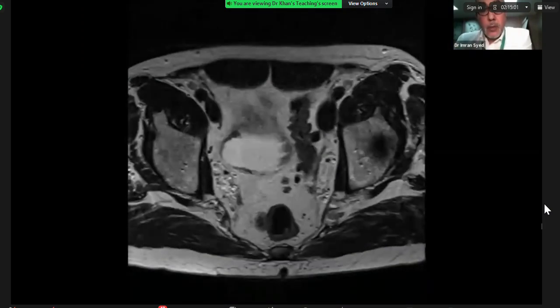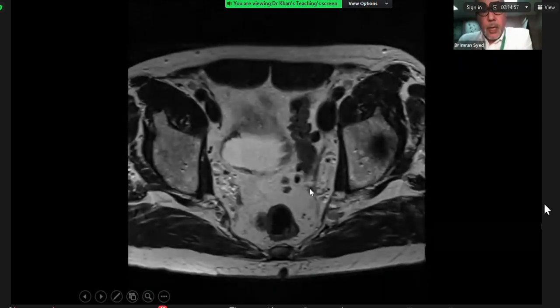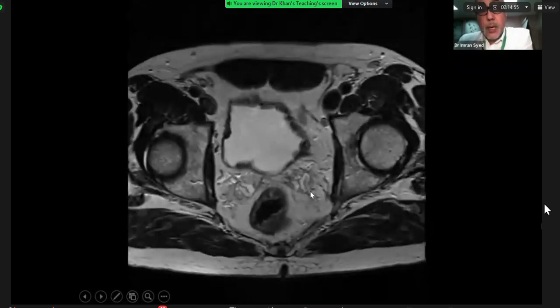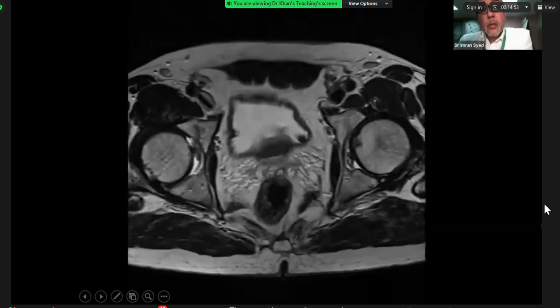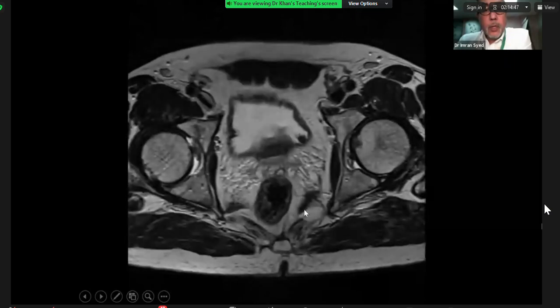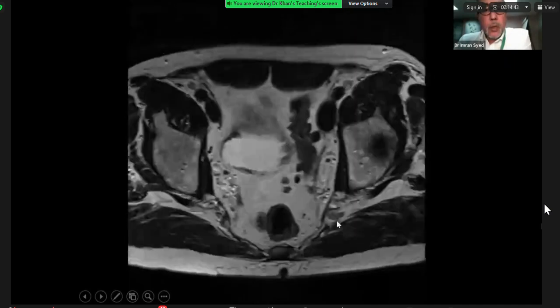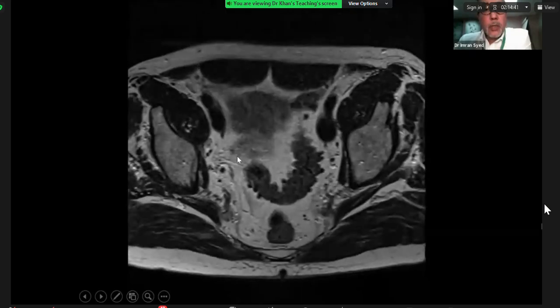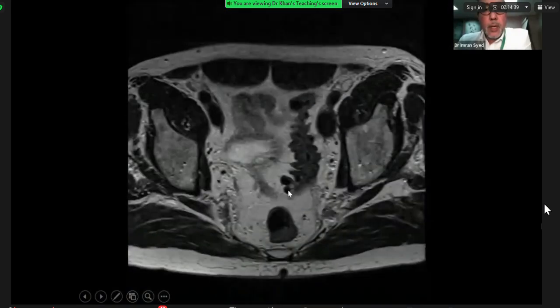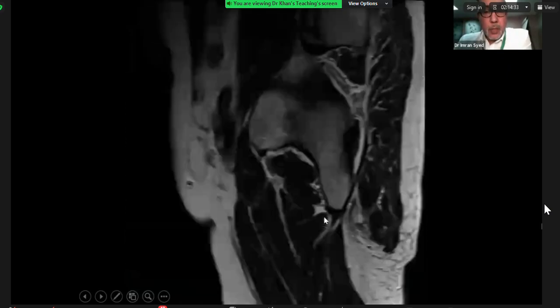I'm just going to go through this as a thumbnail sketch now. Lymph node involvement in prostate cancer imaging, in terms of pertinent negatives to mention: it could be periprostatic, it could be perivesical, it could be pelvic side wall, obturator within this region here, presacral, or along the iliac chain. So always look up the iliac chain as well. Now in this case, there are no lymph nodes. This is a normal MRI prostate.